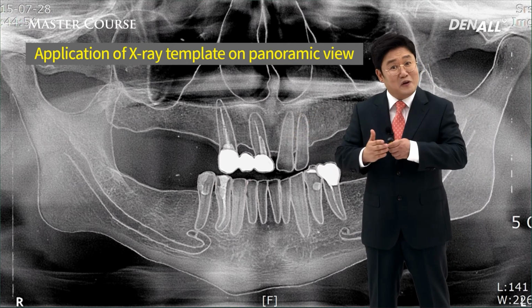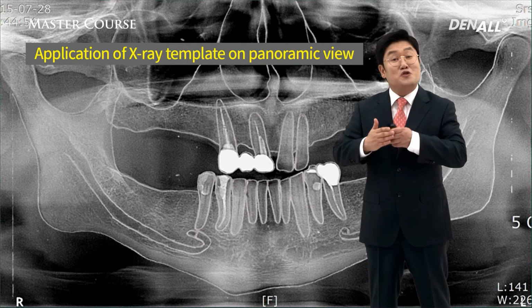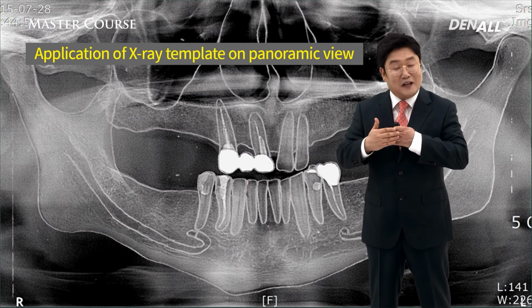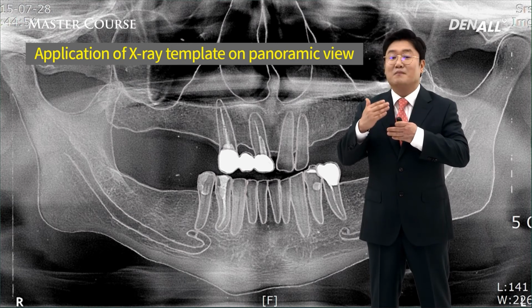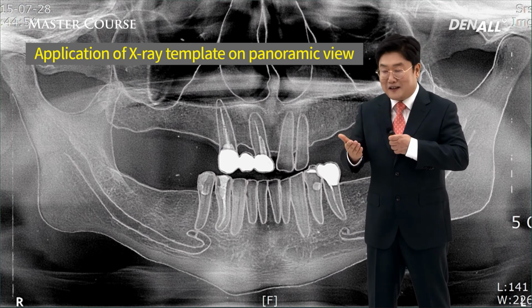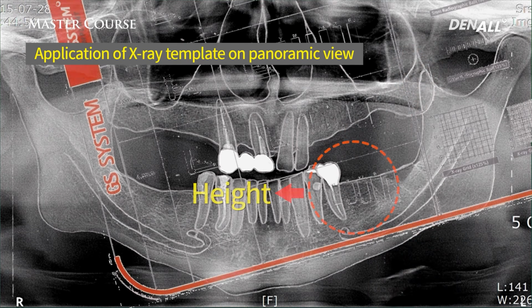The panorama pictures have distorted images. It is mainly vertically distorted. Is it magnified or shrunk? It's magnified. So the 125% magnified X-ray template is shown. Before, you didn't recognize it because it was whitish, but it is actually transparent.